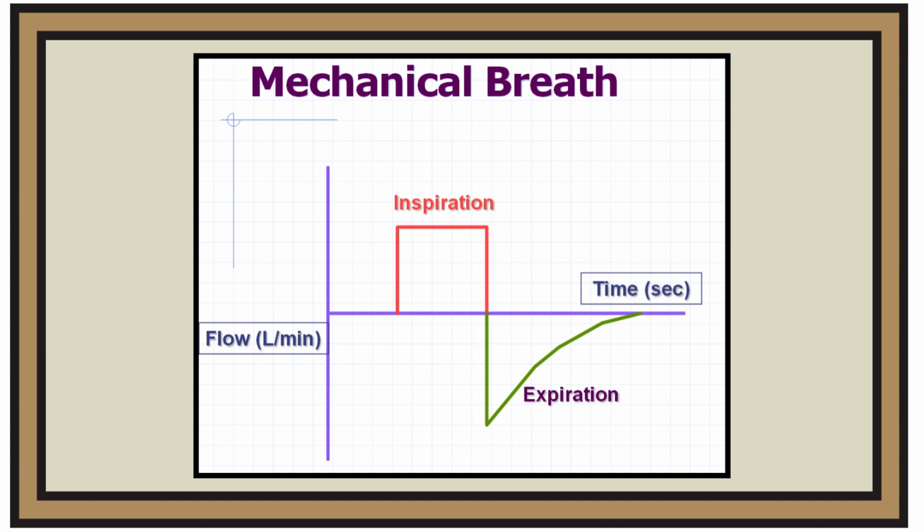This pattern is selected by the operator. There is a significant tracing below the baseline, representing expiratory flow, which is dependent on the patient's lung characteristics and effort. Only the flow versus time curve demonstrates a significant tracing below the baseline.